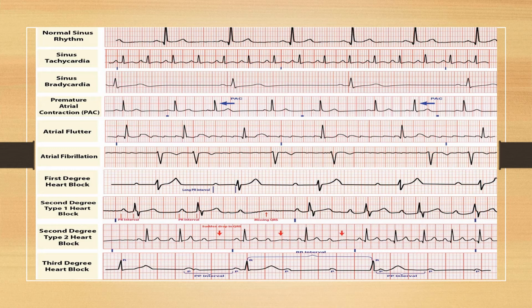So let's have a look. There's a P wave and then a QRS. And I'm going to say that's a T wave after the QRS, and then there's a P wave, a QRS, and a T wave again. And then we get a P wave and oh, there's nothing. It just suddenly dropped it.